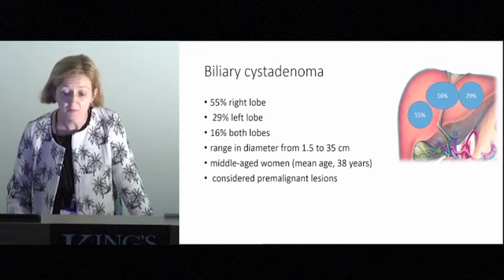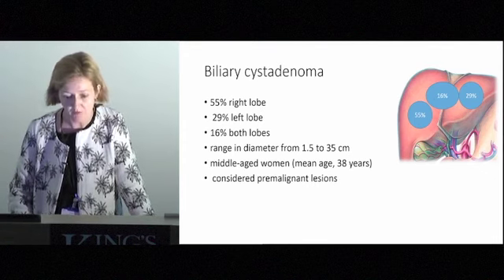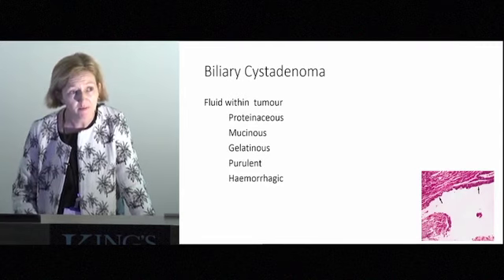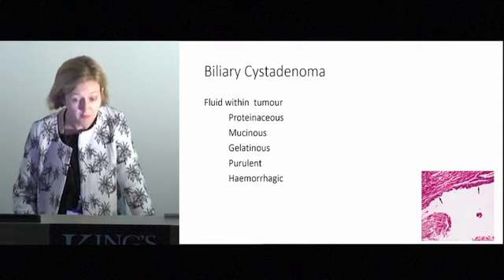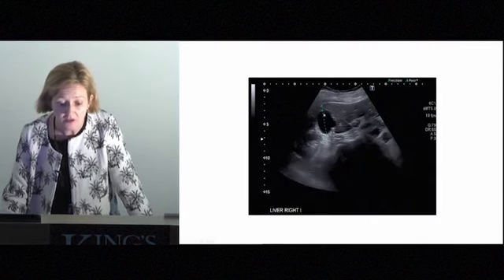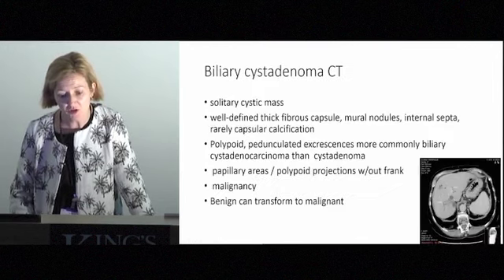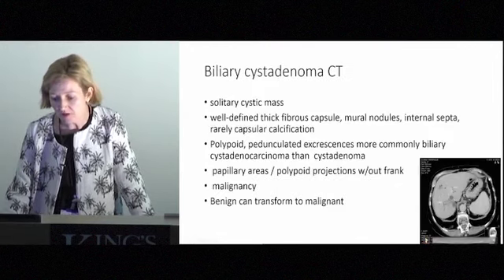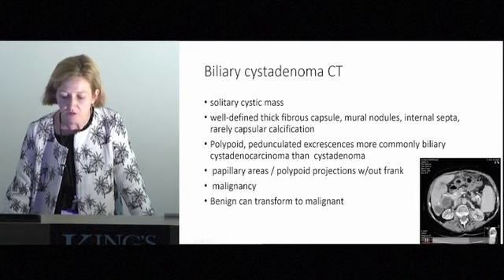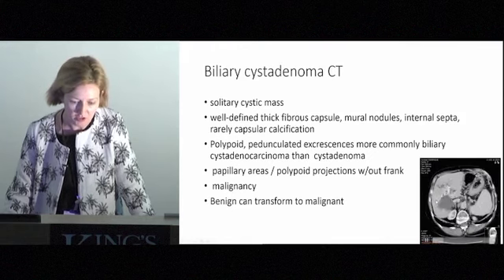Well, we can prognosticate again according to where the lesion is, if it's got complex features, what age the patient is, and how it appears on our imaging will depend on the components of the biliary cystadenoma. This is just an incidental cyst picked up on a 50-year-old lady on ultrasound, a bit of through transmission, and she went on to have a CT scan, which we should quickly play through, and you can see that there are 2 cystic lesions, no significant enhancement, but she does have biliary dilatation.